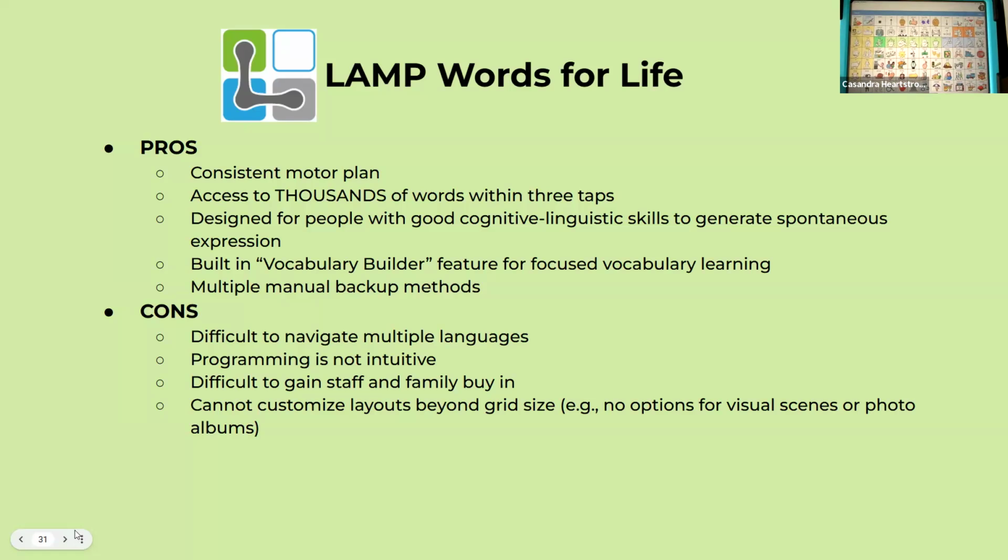It's designed for people with good cognitive linguistic skills to generate spontaneous expression, meaning somebody who's got a lot of words in their brain, they can express exactly what they want easily.